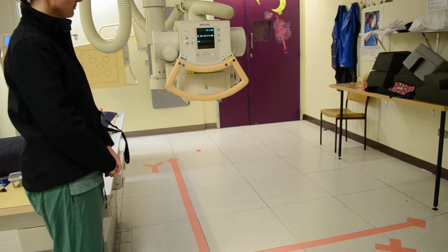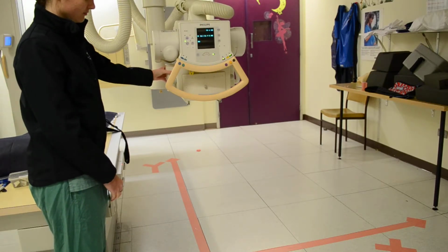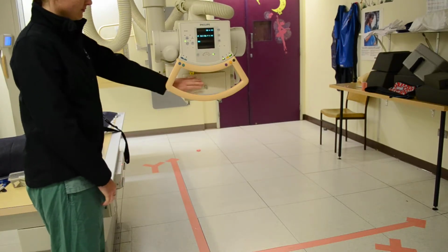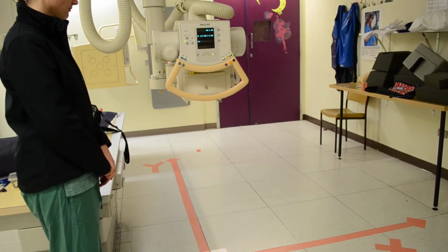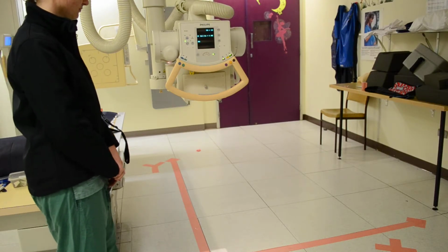The X-rays come out of the tube through a box or a cube that is called the light beam diaphragm, and this shapes the X-ray beam. So wherever the light beam is, the X-rays will follow the same pathway. So at the moment they're basically in a square of radiation.